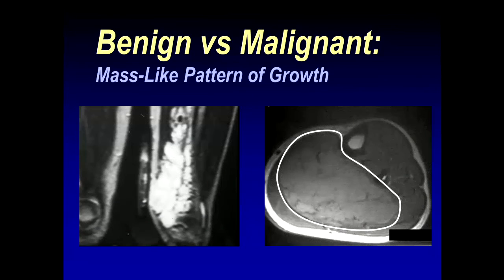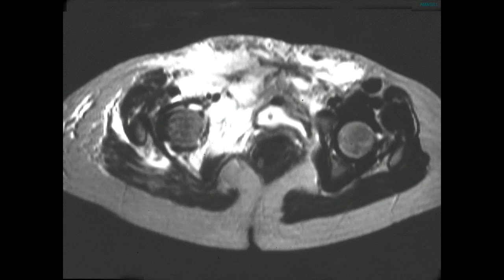And this is the classic growth pattern with a sarcoma, and they're often very well defined, compressing that tissue around it. Now, you may look at this and say, I don't know what that is, but no self-respecting sarcoma would grow like that, and you'd be absolutely correct. It's there, it goes behind the hip. I mean, it goes everywhere, certainly in this patient with a lymphangioma of the pelvis.